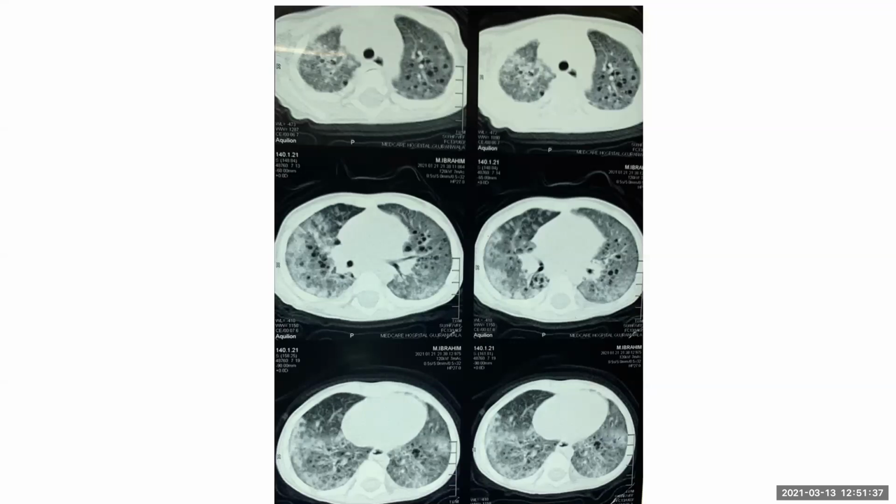I am thinking that as the lucencies and infective process are more pronounced in the apical and mid regions, and I cannot clearly appreciate the basal regions, this could be due to cystic fibrosis leading to infection, as some cystic lucencies are also seen. This could be due to cystic bronchiectatic changes, and this is a young child, so I would urgently convey my findings to the referring physician and discuss with him.